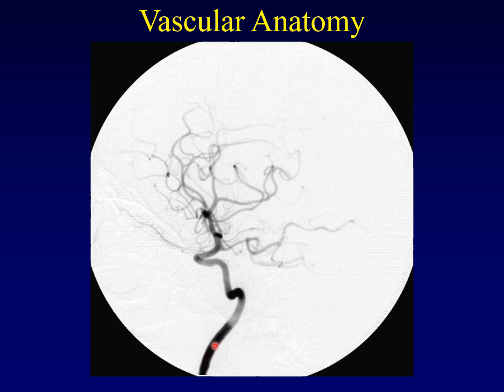How come it's a nice dark tube coming up and then all of a sudden it gets lighter? Did the artery somehow get thinner there? The answer is that this is also an artifact. The digital subtraction technique is really pretty good, but it's not perfect. And when you transition from the soft tissues of the neck to the dense bones of the skull base, the subtraction doesn't work perfectly. And so you're seeing that transition from the neck into the skull base.